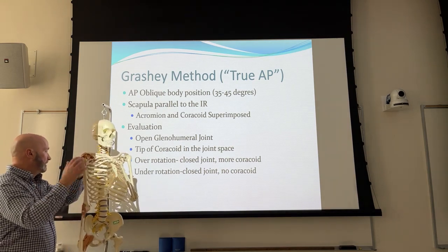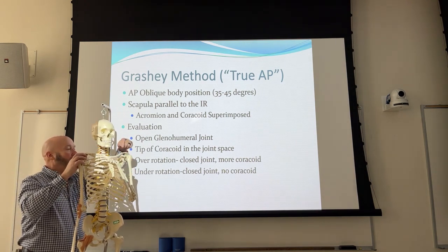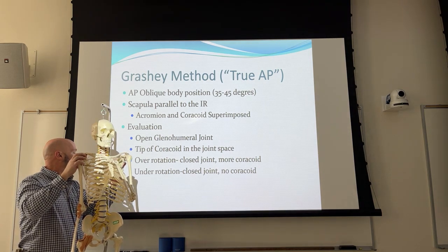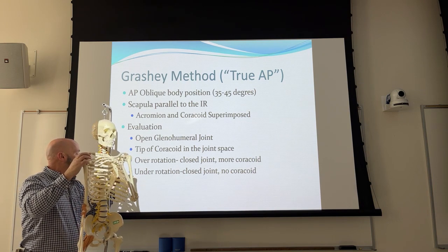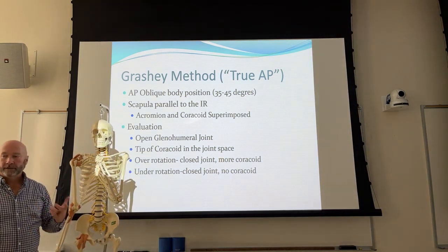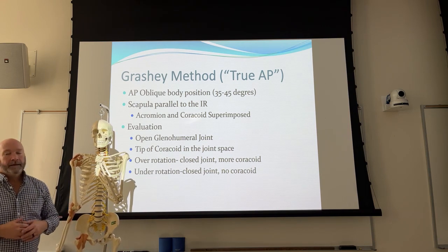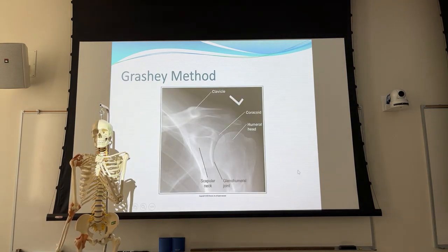First off, let's look at this. Can you see this little thing right here? Sticking out, that little shadow right where my finger's over it. You see that little shadow that changes as I oblique this thing? Mm-hmm. Okay, that's a coracoid process. And your evaluation of the Grashey Method and whether or not you've got good rotation is going to depend on 2 things. And now I'm going to bring up the image. The Grashey Method, okay, so here's the coracoid process here.